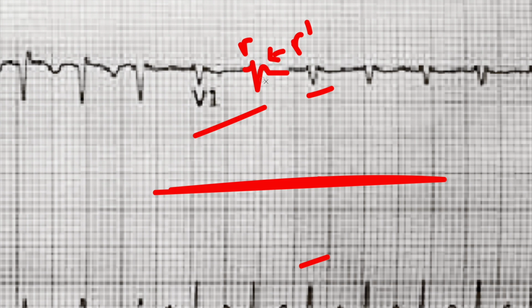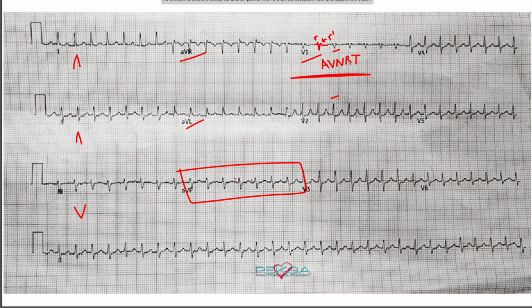And this is typically associated with atrial depolarization that's happening after the fact, which is a telltale sign of nodal SVT, right? So in this case, this would be enough to make a determination that this is AVNRT. Now, this is an extremely complicated subject, and I will not be going into any depth here when it comes to AVNRT in this video.